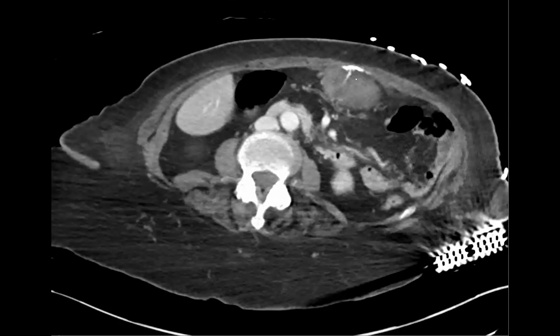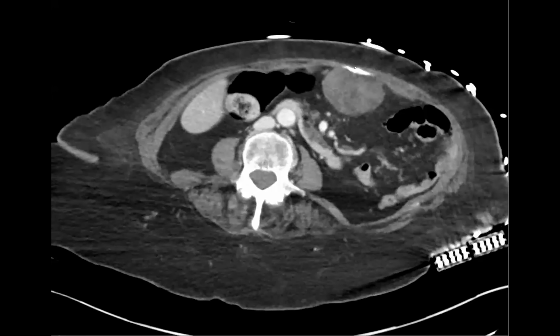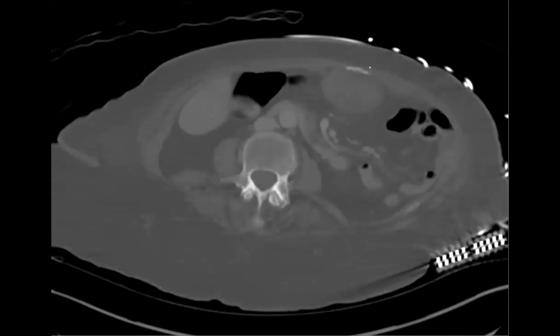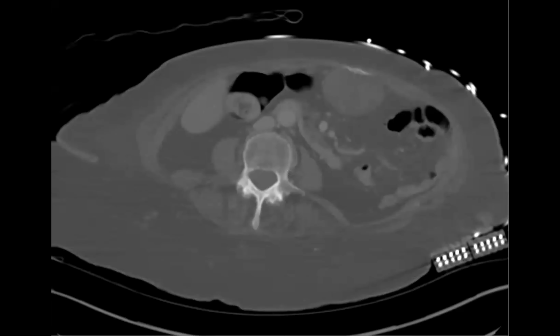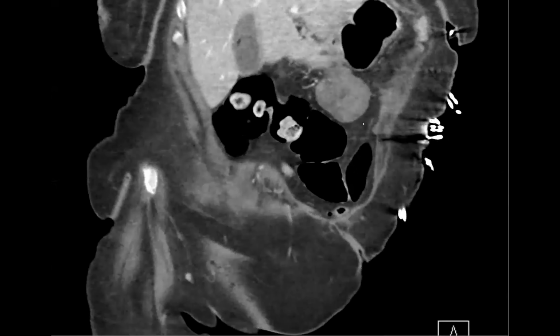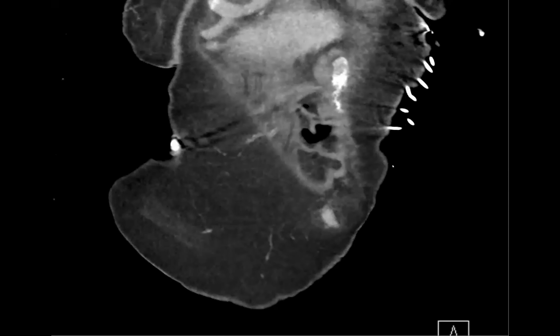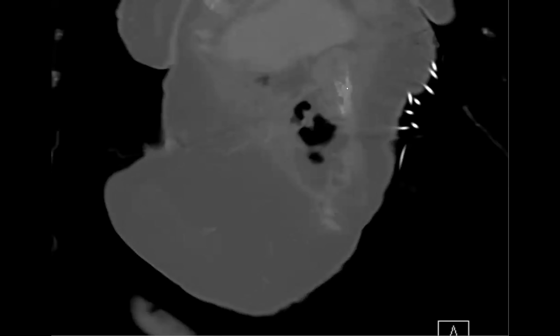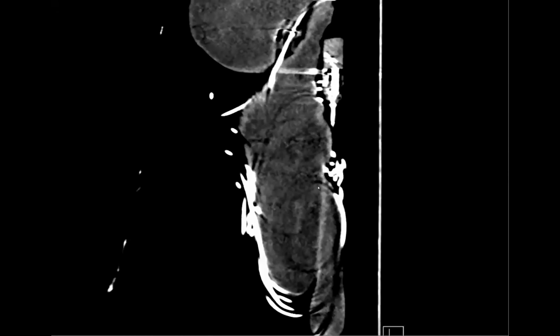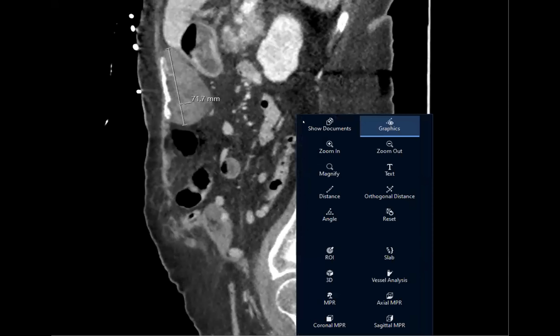There's a mass here. There's this linear part, but then there's this other linear part. Maybe some kind of fibrosis that encapsulated that thing, whatever it is. And this is what it looked like on the coronal. This part almost looked like some kind of dystrophic calcification, and then there's that more linear calcification there. Is it a desmoid?